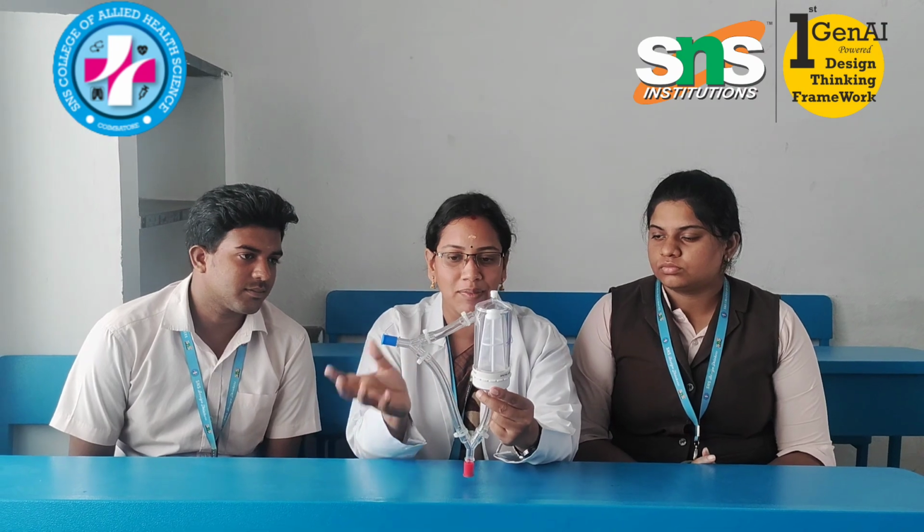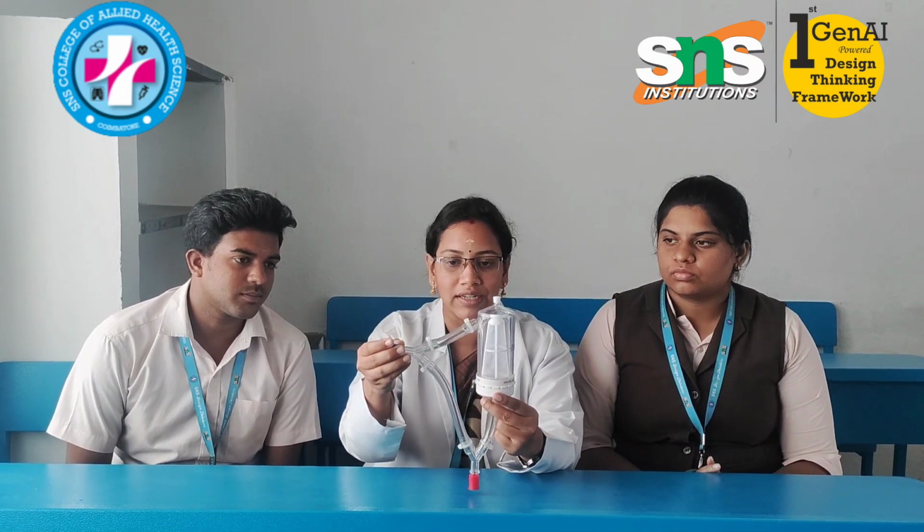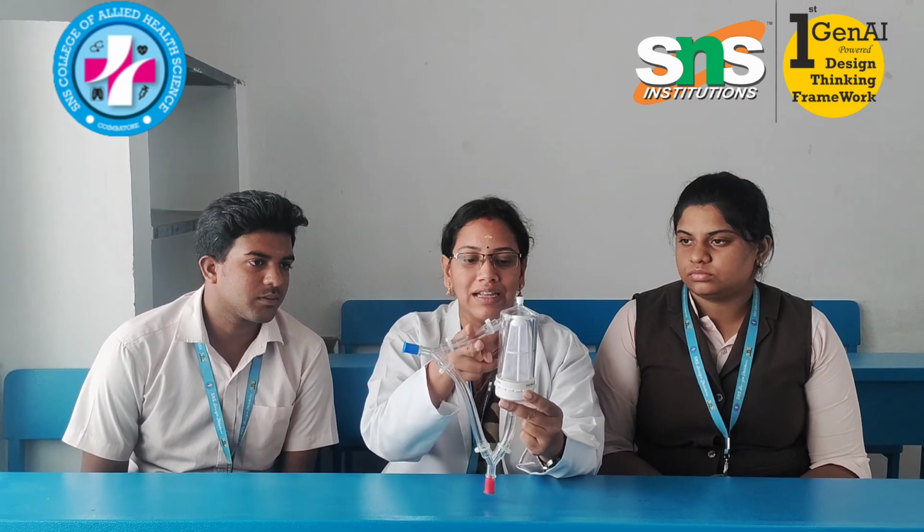The main purpose is to act as a final defense mechanism to remove all the air before it enters the patient. This device is assembled in the extracorporeal circuit where the inlet is connected from the oxygenator. Before priming, you have to do the assembly procedure. It can also come as a pre-assembled circuit from the customer, though some institutions assemble on their own. The circuit has an inlet, bridge line and outlet. The first step is to clamp the inlet and outlet line.